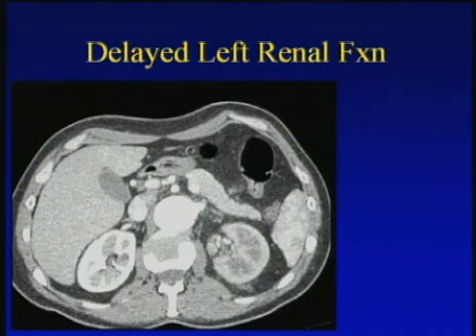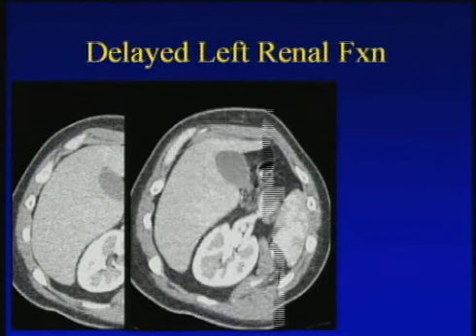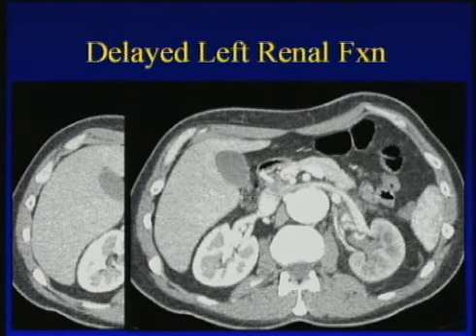Well, one advantage is just looking at perfusion. So if you take a look at this case, this patient has aortic dissection which involved in part the renal artery. You can see very nicely the differential enhancement between the right and left kidney on the axial images. You can see the intensity of the cortical medullary interface is far less on the left than it is on the right. Renal size has not significantly changed, at least on that axial imaging, but you recognize the perfusion changes.